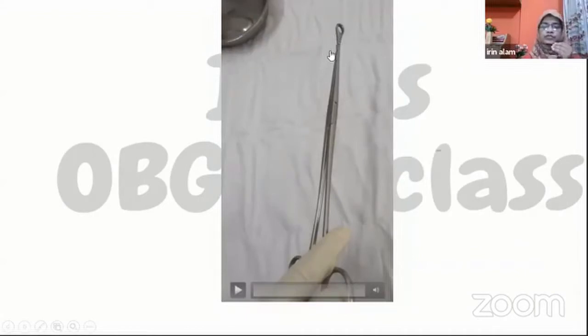Swab holding forceps is used to paint the abdomen or vagina for giving wash. Gauze are held with this end. We also use this instrument for evacuation. If a large amount of products of conception is retained in incomplete abortion, this can also be removed with this.